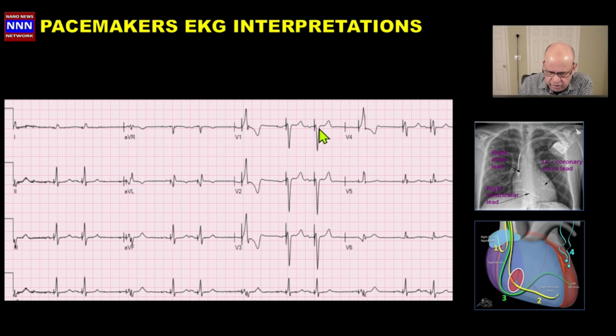followed by ventricular pacing. And here we have a QRS morphology which is different. We see an atrial pacing and a long interval here. It is not clear if this is a change in leads. So we don't see an atrial pacing here. All we see is a ventricular pacing, and the QRS is wide, or maybe it is an extra beat because we had a normal beat, a premature beat, a pause, followed by a PVC.